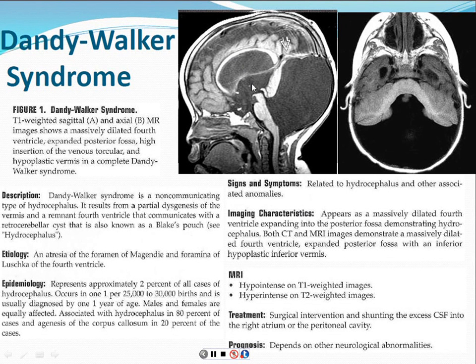So there's a continuum of these anomalies. Whether the patient has any symptoms or not depends on how severe it is. Sometimes it'll be a really subtle anomaly, and sometimes it'll be really large like this. A lot of it has to do with exactly what went wrong along the development, and it can stop at any part along the way, just like with the corpus callosum, and be a partial or a complete absence of the corpus callosum.